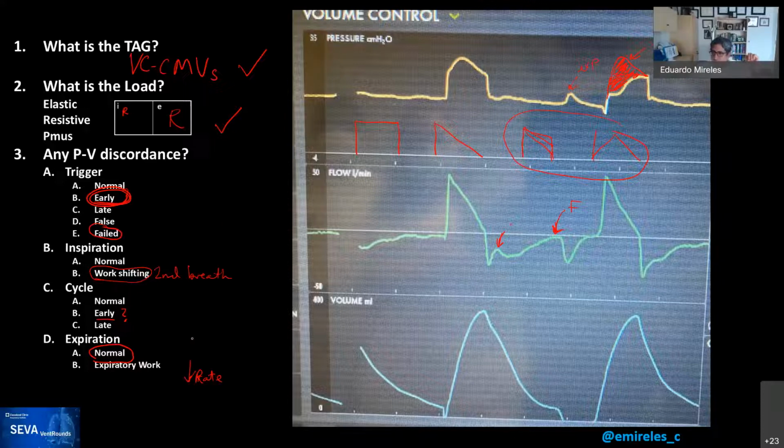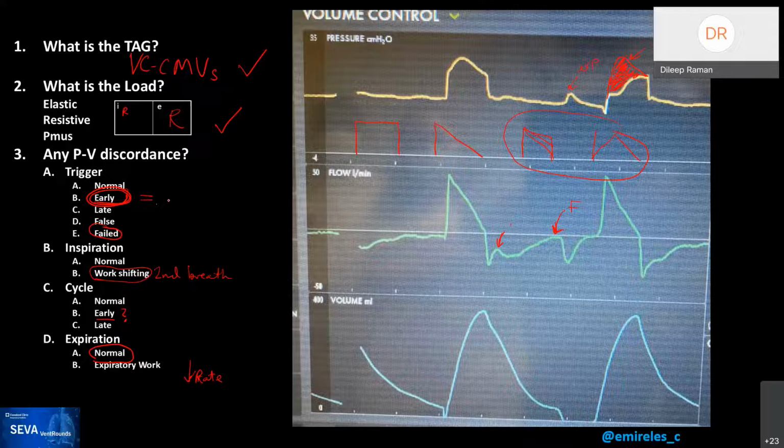Servo U secrets. Yeah, because that would confuse me. Like if you have a decelerating ramp and dual kicks in between, I don't know how you could say that dual was not active on the first breath. Yes, it looks like resistance, but I don't know. I would wonder if you can have that active, but sounds like that's not even possible. So that's actually great to know. Yeah, good. Knowledge generation.